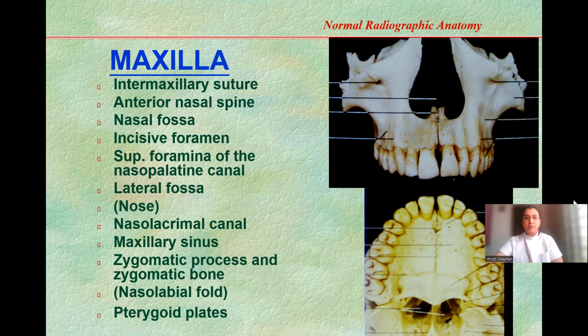So what are we talking about? We are talking about the maxilla. You can see the maxilla over here. This is the specimen of a maxilla from the anterior region. And over here in the second photo down there, you can see it when you're seeing from the palate. So we're going to see the arch and the palate. Just a rough introduction I'll give over here.